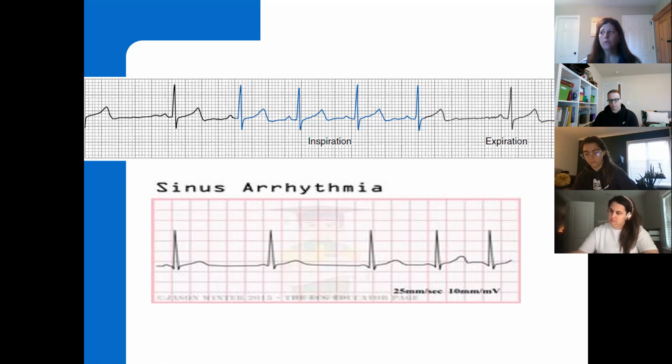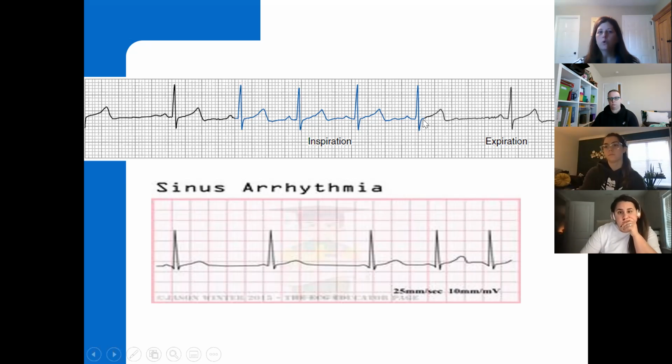You think about when you breathe in and then before you exhale. I mean, we really don't think about breathing, right? It just happens naturally for us, thank God. We don't have to think about taking a breath in and blowing it out every time. We'd get nothing else done other than thinking about keeping our breathing going. But if you pay attention to your breathing, it makes sense that it's definitely more of a normal rate here, and then you see the pause right before the expiration.